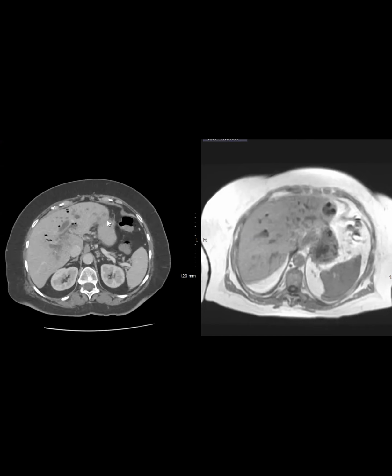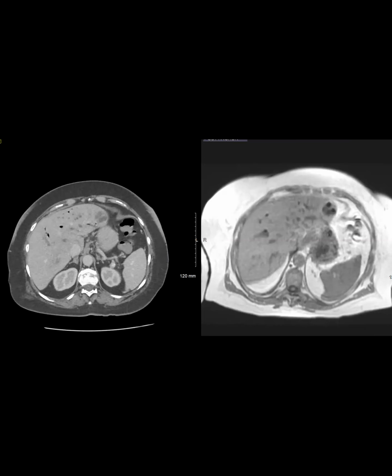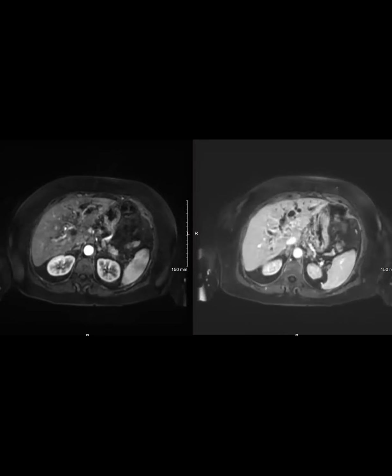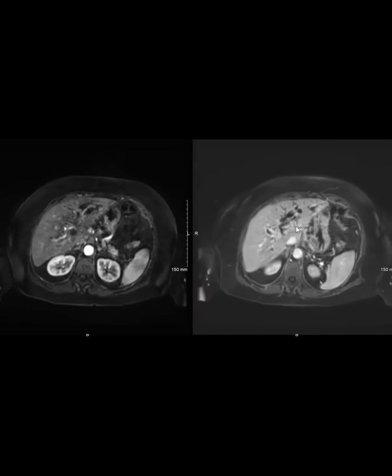It's not biloma, it's an abscess, right? Yeah, right? I guess I would call it like an infected, exploded bile duct kind of abscess. So I do think it's related to the cholangitis and infected, but the air, I think, could be communicating with that bile duct that communicates with this thing that came from the biliary tree. I haven't seen that in the literature. I've never seen the discussion of liver abscesses communicated, like in the setting of cholangitis, there's communication. They're just feeding of bacteria, but whatever it is, it is an abscess with air.